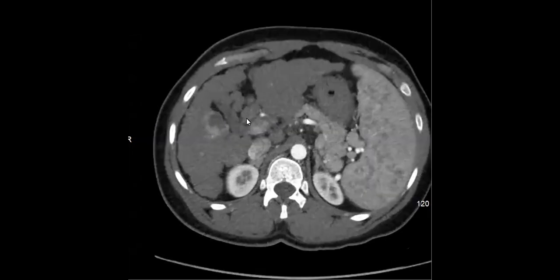Thoughts? Should I just go through? I'll make comments, but anyone else who wants to make comments would be awesome. This is an arterial phase. It looks decent because there's mixing in the portal vein. The lesion looks like it has arterial enhancement with a central area of non-enhancement. I'm concerned about an HCC with maybe central necrosis.